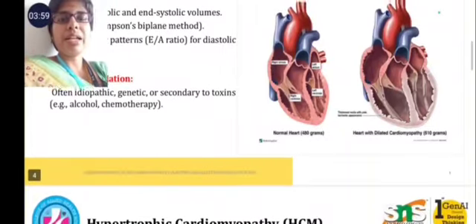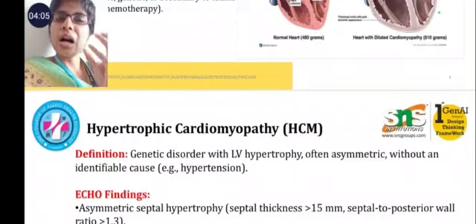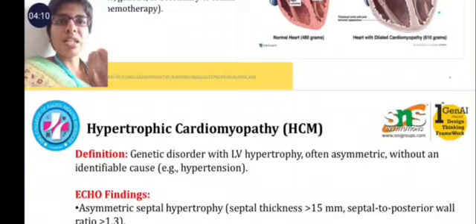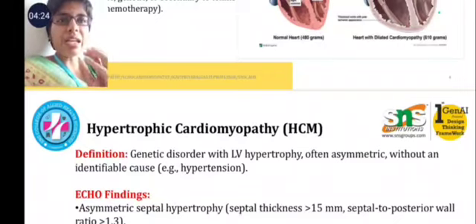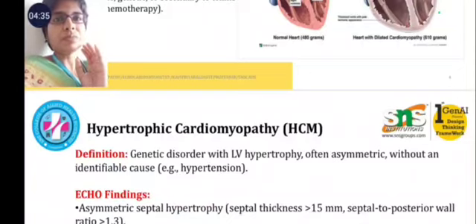Dilated cardiomyopathy may be due to idiopathic causes, sometimes genetic. If it is due to ischemia, there is septal or global hypokinesia, which affects the heart globally. Sometimes if it is ischemic, some areas like the LV apex may be akinetic, but all other segments are hypokinetic. In that condition, thrombus or clot must be present in ischemic heart disease. At that time we also note arrhythmias in the ECG.